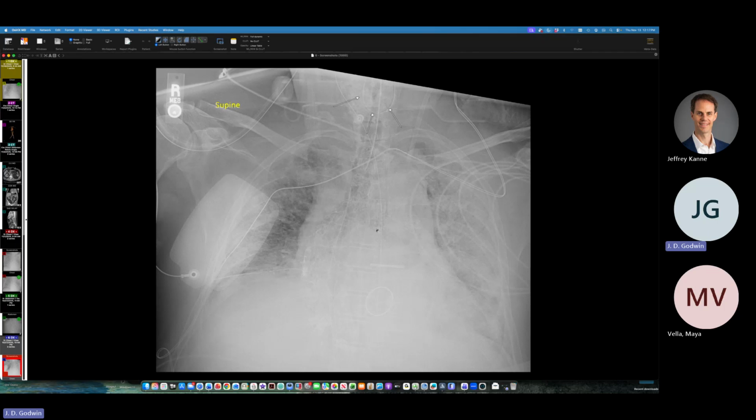So they went back in and put in a different model. Then they had to close atrial septal defects that this person had too. So this person initially had two of these devices placed. They did atrial and ventricular in this person. And this person, we see just one at this point down here.